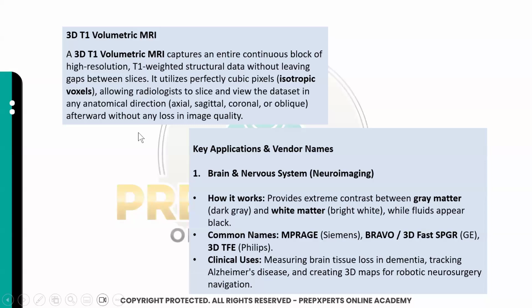We can see that here on the visible here. So I know that this is T2. And there is this hyperintense signal area in the same territory.